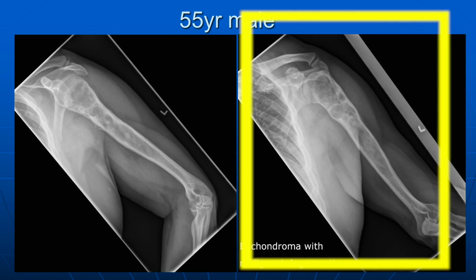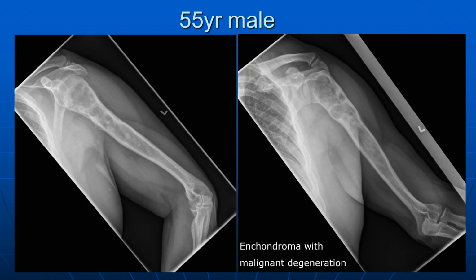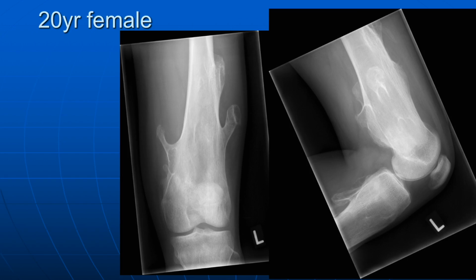And then this follow-up image showed it broken out of the bone, and his chest CT showed he had lung metastases. By that time, there's basically no point in taking out the humerus if it's already metastasized. And these tumours aren't responsive to chemotherapy, so bad news. There is an argument still for performing the surgery on his arm, because if you don't, the tumour's just going to grow and grow, and then it's going to start to fungate. So he probably does still warrant the surgery, but it's not curative.